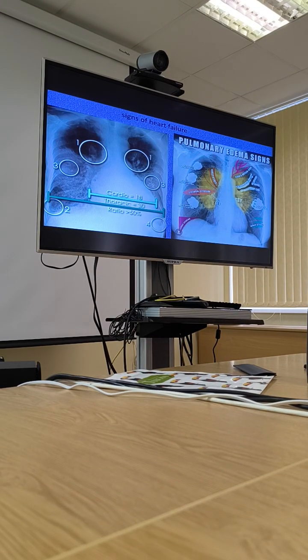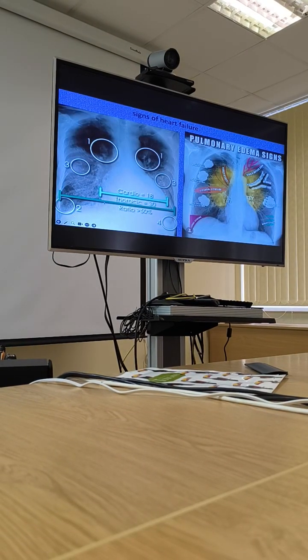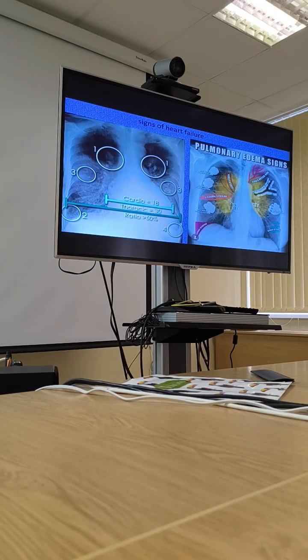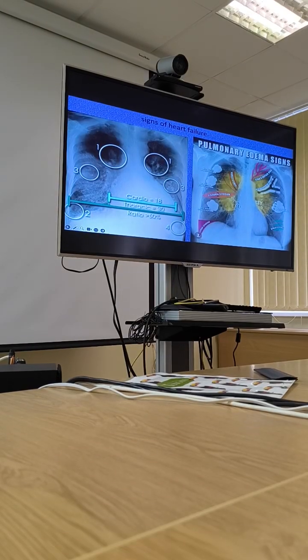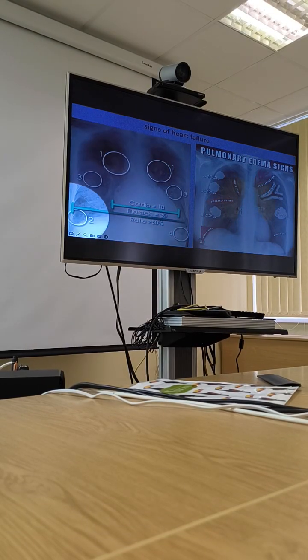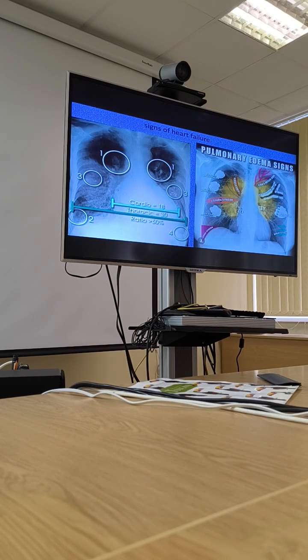So we pay attention and take into account the heart size. The bigger the size, the worse the situation, along with signs of pump malfunction. First of all, the hila become enlarged and unstructured. Then we look at the sinuses; these angles should be sharp, and if they are not, there is fluid collection there.